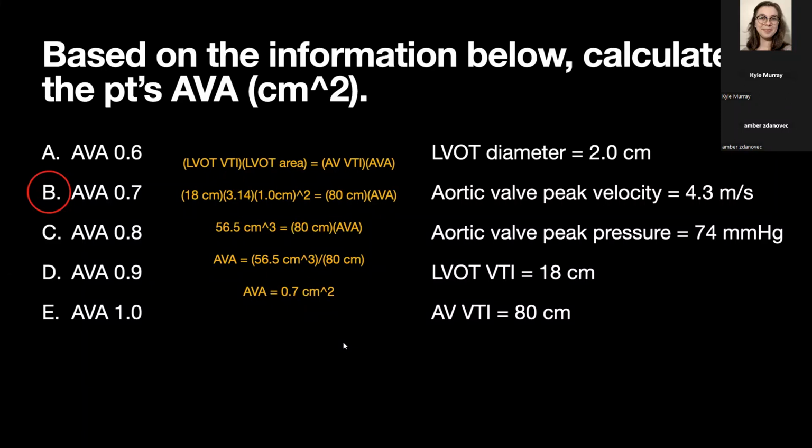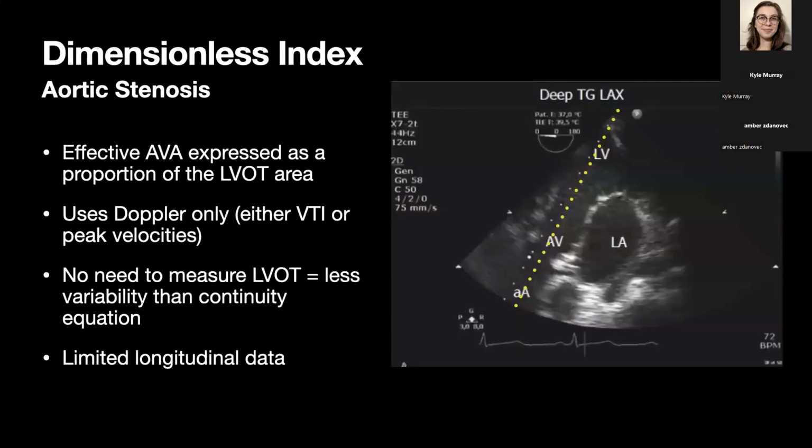This is the worst part through the whole thing. And again, actually, the computer will calculate this if you know how to properly label all of your measurements. If you're just taking measurements but you're not labeling them, the machine will not calculate for you. Okay? So that was aortic valve area. And then the level ones were peak velocity, mean gradient, aortic valve area.